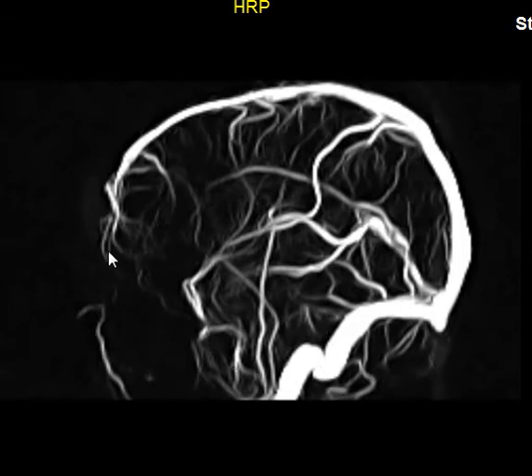Okay, you look for the midline one, the big one, which is the superior sagittal sinus, and this small one that runs on the inferior edge of the falx cerebri, which is the inferior sagittal sinus. The inferior sagittal sinus will join with these deep veins.